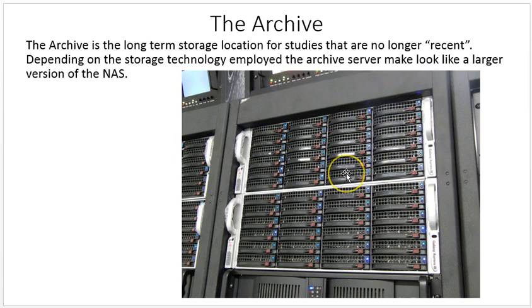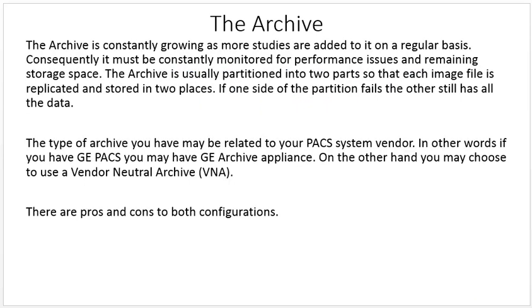Same things, instead of the drives being oriented vertically, now they are horizontal. A whole bunch of drives in these racks. It's an archive. The archive is constantly growing as more studies are added to it on a regular basis. Consequently, it must be constantly monitored for performance issues and remaining storage space.